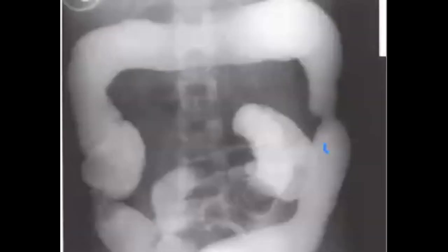Okay, so if we go more deeply and shift to the large bowel, especially if you find an image like this that is usually a frequent spot diagnosis, the question will talk about the patient in the keyword.